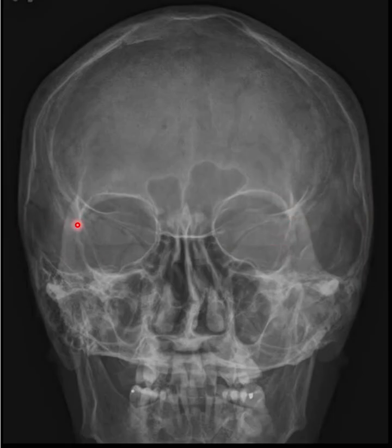It's closer. So this tells me that the patient was turning towards their right. Their eyes are looking towards the right side of their head. So we have a tiny bit of right rotation in this image and maybe some insufficient flexion or excessive caudal angulation errors in this image.